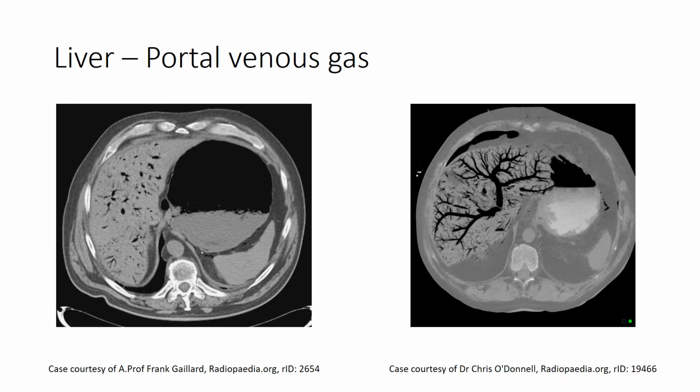This is the opposite of the appearance of portal venous gas, where gas is usually seen in the more peripheral vessels due to the usual hepatopetal blood flow away from the hilum. This can be seen particularly in the image on the left.